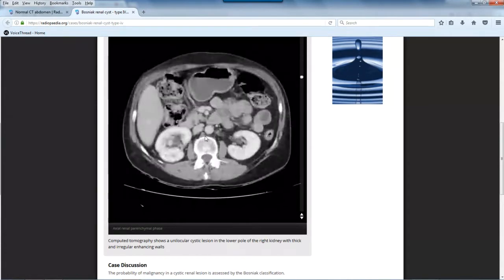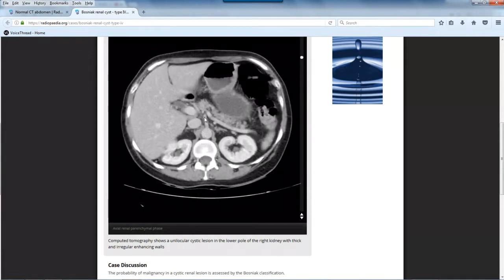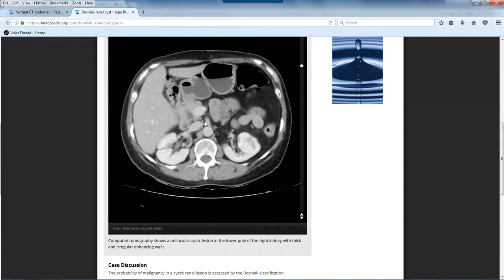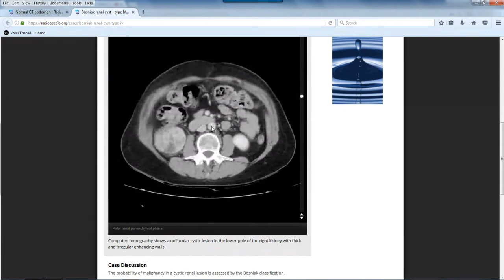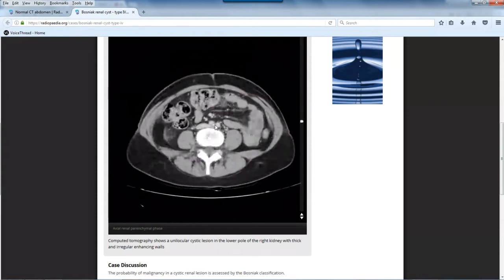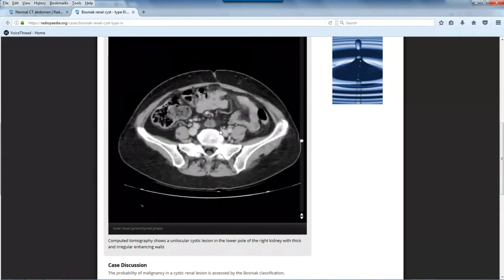So we can still see our vessels coming off of the aorta. You can follow the aorta down because this is the same patient. So there's your celiac, there's your SMA, the IMA, we're going to see that calcification where it should be. Follow it down, and then here is where the aorta bifurcates. Okay, goes down and spreads into the left and right common iliacs.